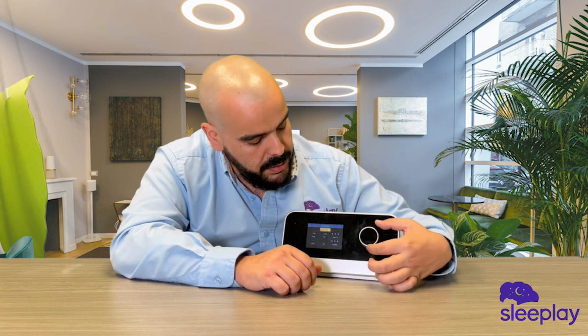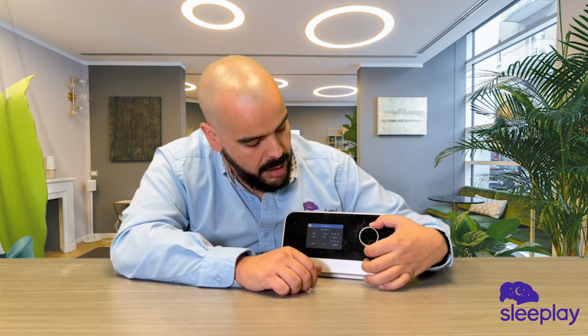But take it in steps. You want to start off, once you know you have sleep apnea and they sent you a machine, your main goal needs to be getting used to your machine. And the Resvent iBreeze makes it pretty simple because everything's on the screen. You can just scroll with the knob and select what you want to see and what you don't want to see. If you want to use it on your phone, it might be a little bit more difficult. I'm hoping that Resvent sees this and works on the app and gets it to work better.